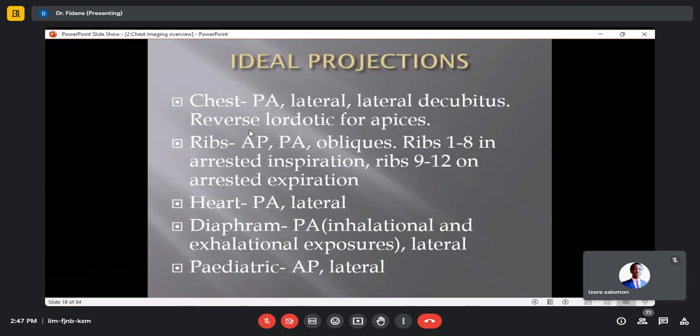That's physics. Because the X-ray source is posterior to the patient, the heart is far from the X-ray source, meaning the shadow of the heart will become smaller. And we will not think of cardiomegaly or something else like that. All structures become smaller than for the anteroposterior views. That's the reason why we prefer to do a posterior view of the chest.